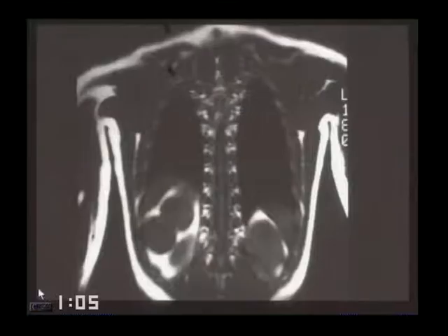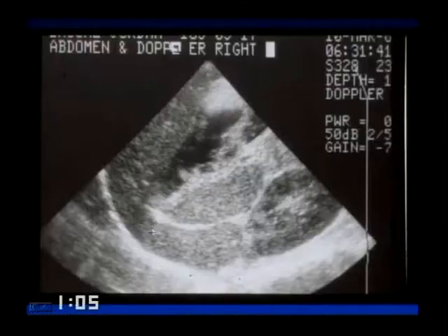It's just a coronal MR to show you multiple right-sided spleens in a patient with polysplenia. Again, that will be discussed in more detail in the pediatric portion of the course. But here in this ultrasound, you can also see that you're in the right upper quadrant, and next to the kidney, there's a texture of spleen with multiple foci, and again, this is a patient with polysplenia demonstrated by ultrasound.